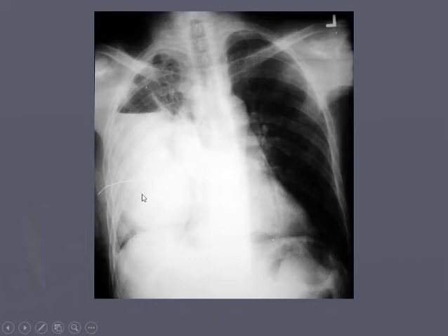But up here, we're seeing our meniscus. We're seeing a fluid line, okay? Typically you don't see flat lines on a chest x-ray, especially when it comes to densities. This is fluid. It's just like a glass of water just sitting up there. This is a loculated effusion. It's trapped. You can actually see the chest tube right there trying to drain all that stuff out. It's a loculated effusion right there.